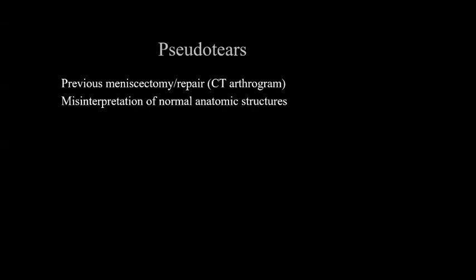I mentioned this earlier about the meniscal changes and the post-meniscal changes. The post-meniscal changes can be problematic for MRI. And the reason why, and we see this quite often in patients with prior meniscal repair, is because MRI scan will demonstrate high signal intensity in the meniscus, even if the meniscus was repaired previously. And it could be a problem for the orthopedic surgeon.